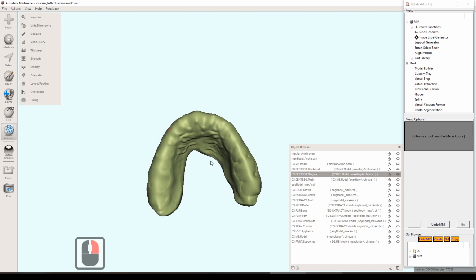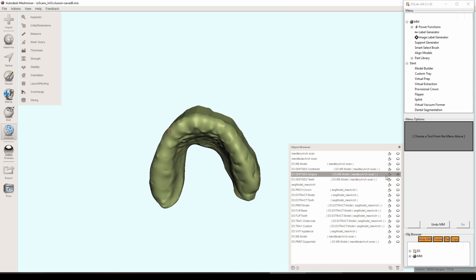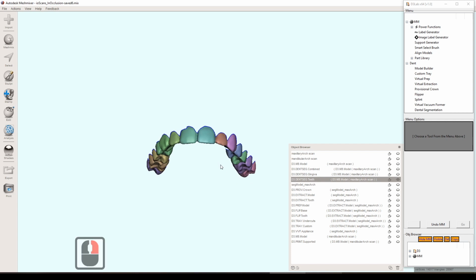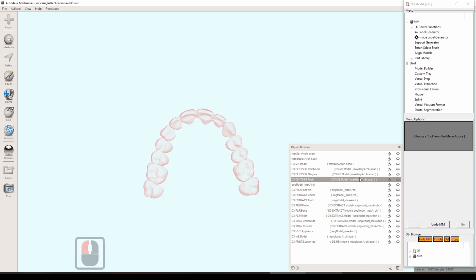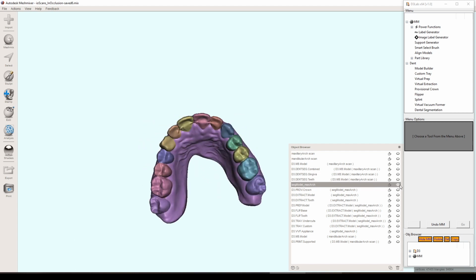And then once you have this model, if you needed to use this for any other tool or as a refractory model for something else, you could just print this out. But then you also have their original teeth, which you could then make a provisional from, and you basically have their exact occlusion, their exact anatomy, everything, just right away. So the segmentation is important, not just for statistical details and for deep learning and stuff. It's truly just functional. It helps you select things and pick things out and do a variety of different things from that. So you got the teeth, like I said, the gingiva, combined. Then I think I renamed this just to keep it simple. So it's the same thing.